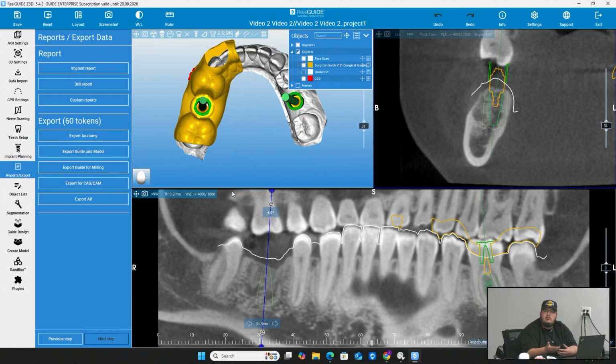Of course, you can double click it and look at it in a 3Shape model viewer or in Meshmixer and identify it that way. But to keep things simple and easier for you, definitely change the name on here so you can identify which is which when you're exporting.